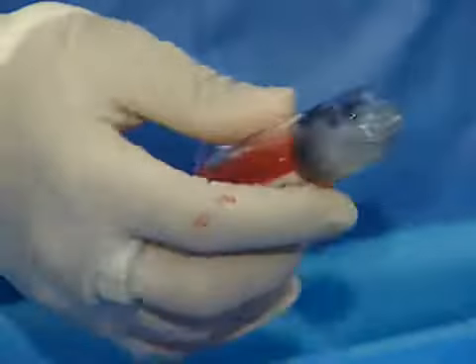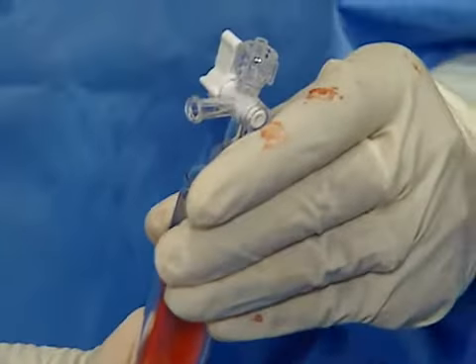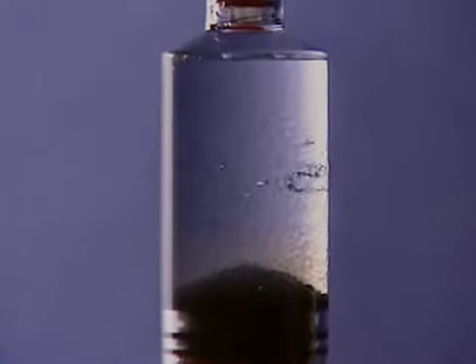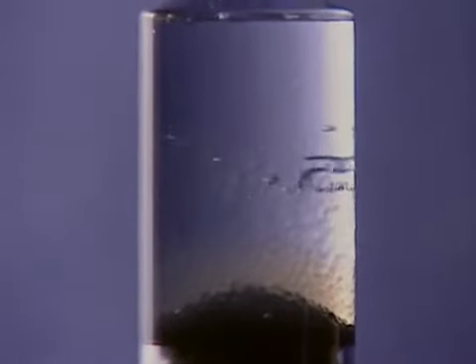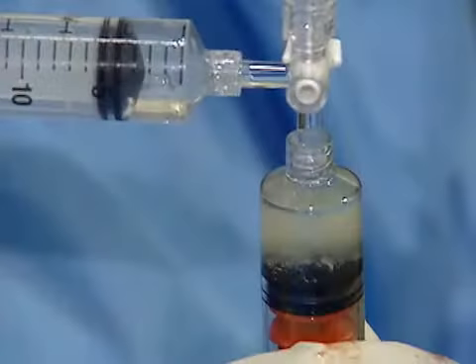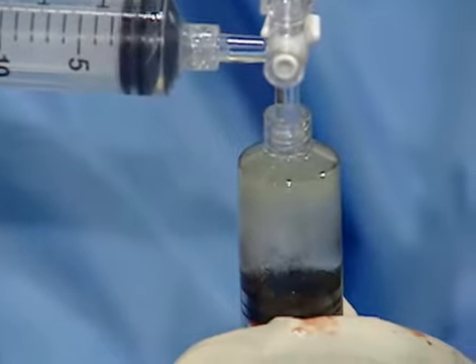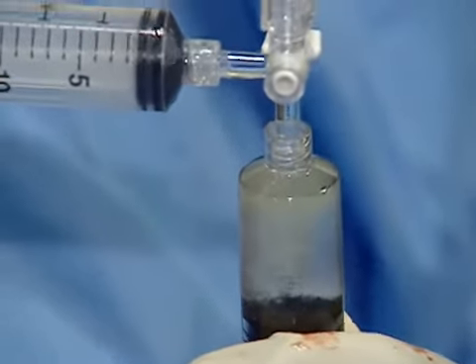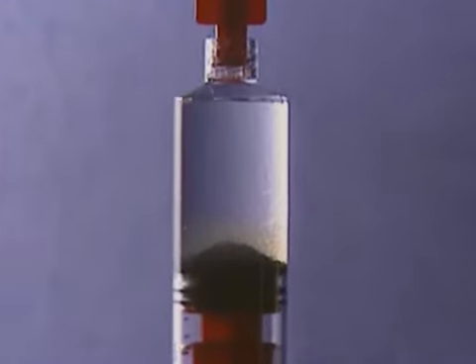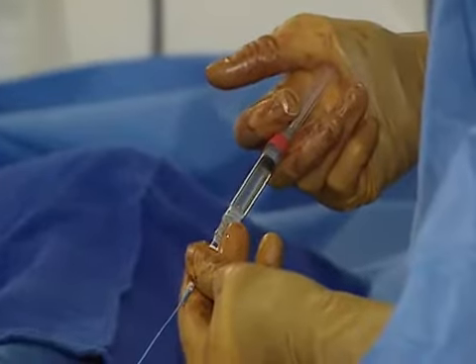Embosphere microspheres, the first cleared embolic material for UFE procedures, are most commonly used. Embosphere microspheres are round, hydrophilic beads made of an acrylic copolymer. The smooth, round surface of the beads prevents clumping within the catheter and the blood vessels, promoting ease and accuracy of delivery, and ensures that the vessels are uniformly blocked. In addition, the elasticity of the microspheres facilitates passage through small delivery systems.